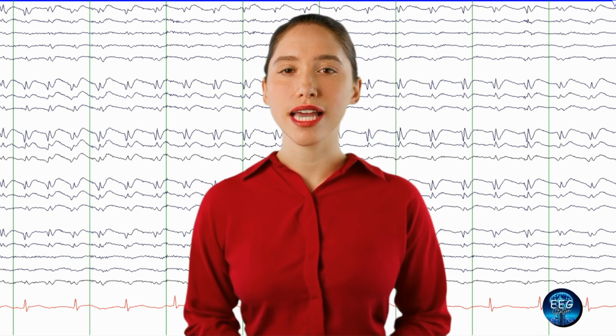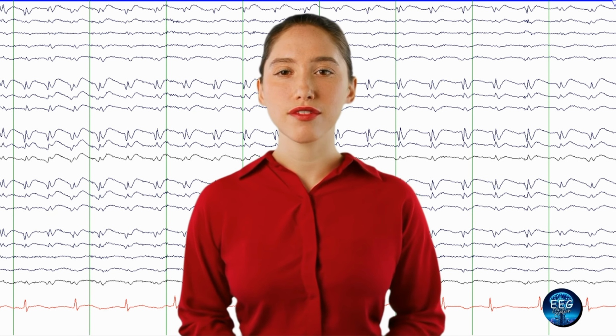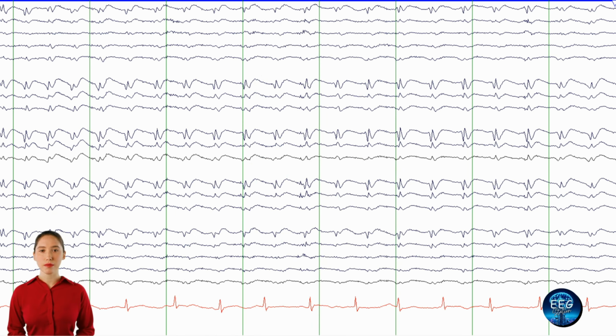On this EEG page is a portion of a generalized non-motor electroclinical seizure with behavioral arrest recorded during hyperventilation procedure. Due to the pediatric patient's age and the less than 3 Hz frequency of many of the bursts, the EEG would better align with a childhood absence epilepsy as opposed to a juvenile absence epilepsy, though other generalized epilepsies cannot be entirely precluded utilizing only the EEG. A diagnosis without careful clinical consideration is not appropriate.